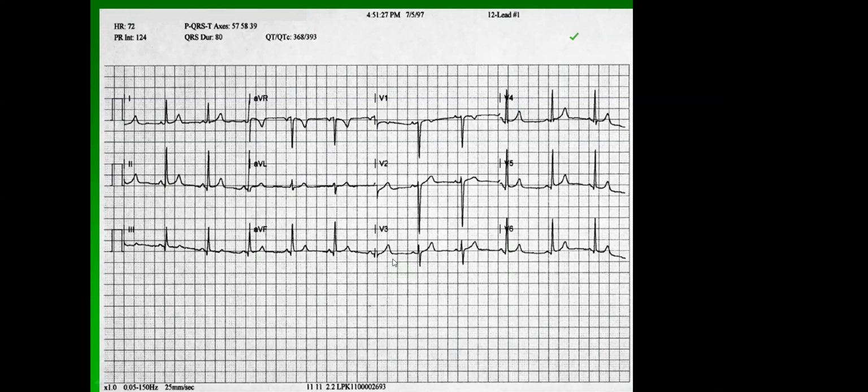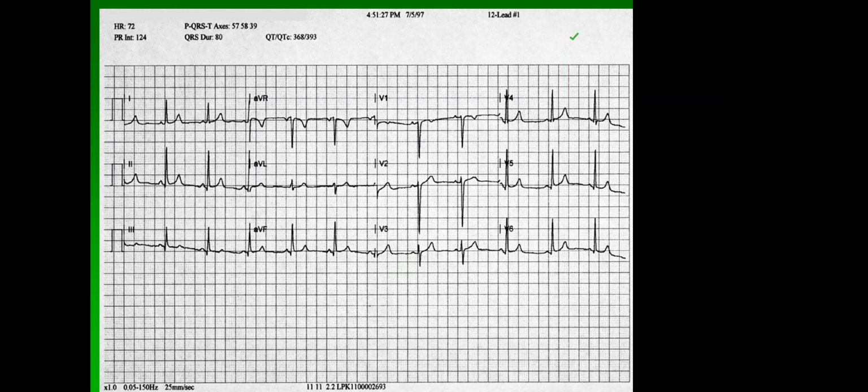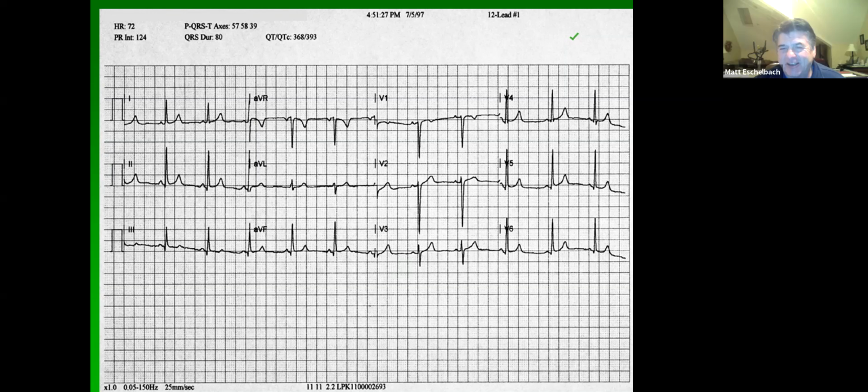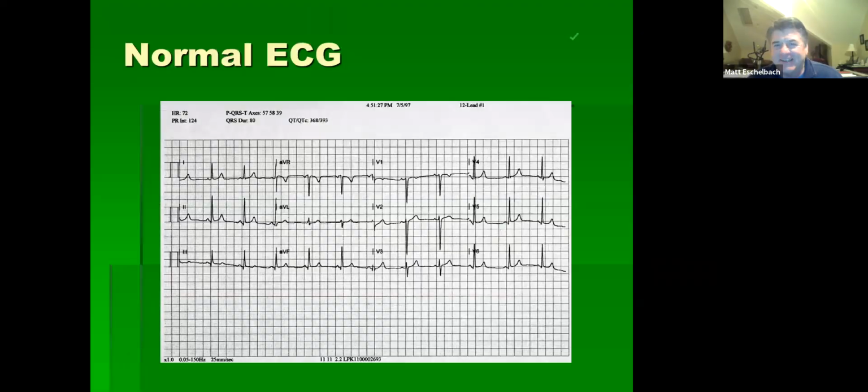So you said this was a fork, meaning normal. You said this was no ST elevation. So you're trying to tell me that this is a normal EKG? Well, I don't know. I guess I maybe talked myself out of it just by over-studying it. Stick with your gut. I'll stick with it that it's more normal than not. Good. All right. It's a normal EKG.